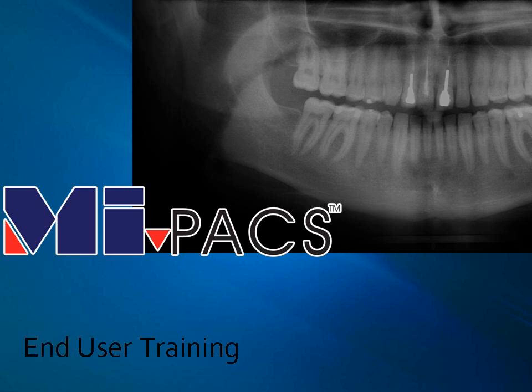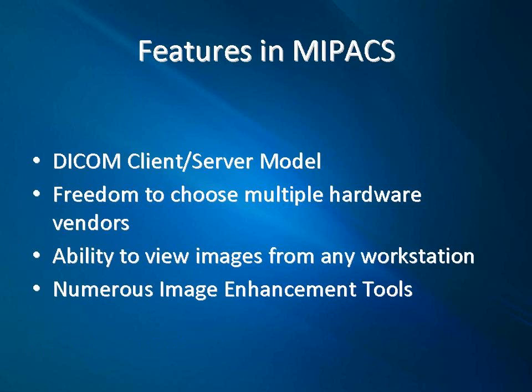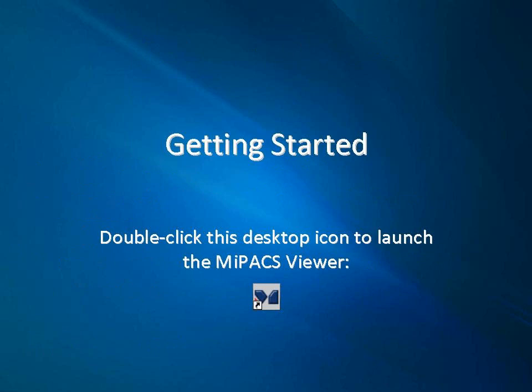Welcome to the MiPACS Dental Enterprise Viewer End User Training. The MiPACS software suite boasts feature flexibility to complement the industry standard DICOM client-server model. To launch the MiPACS Viewer, double-click this icon on your desktop.